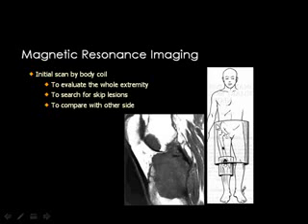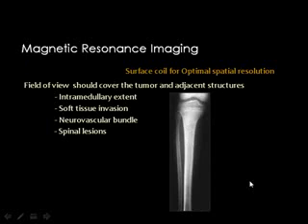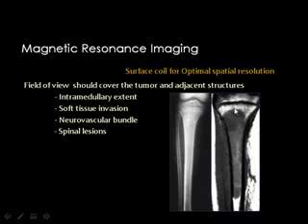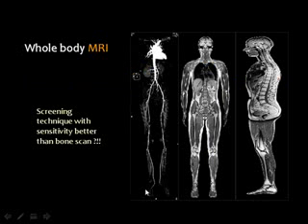And you should scan both limbs for comparison, for any bone marrow abnormality, residual red marrow, and other pathologies. Then, what do you think about this tibia? It looks like a normal tibia, but the MRI showed an extensive marrow infiltrative lesion, which has been proved to be an Ewing sarcoma.